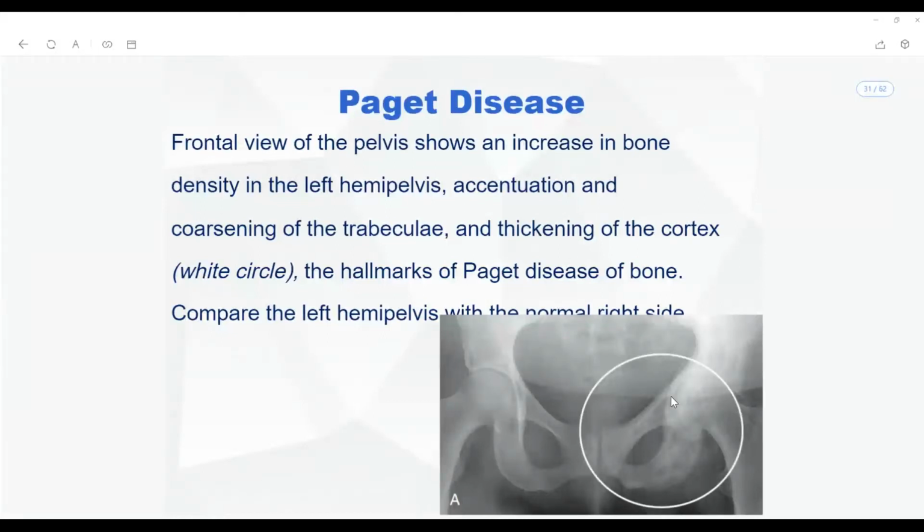So can we conveniently say that the femoral head will be normal here? Yes, obviously the femoral head is normal, but it is causing a heterogeneous density over the femoral head. In such a situation there is a liability that you can make a misdiagnosis of avascular necrosis.